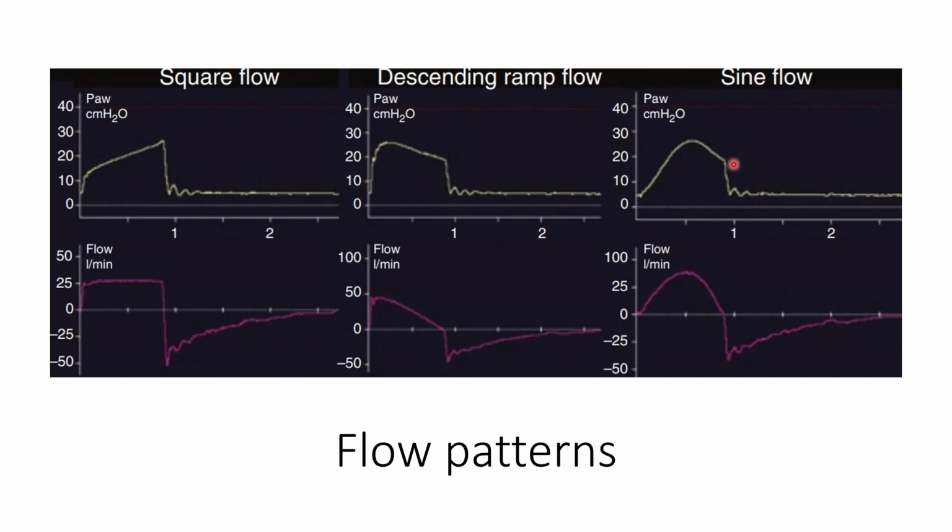So this is the sine flow, where you will see the flow gradually increase to a maximum at mid-inspiratory time and then decrease back down to zero, often used in spontaneous or pressure support mode. Its main significance lies in the fact that it provides a more physiological flow pattern mimicking spontaneous breathing. So it may improve patient comfort and synchrony compared to square wave. So they say that sine wave is better physiologically compared to the square flow pattern.